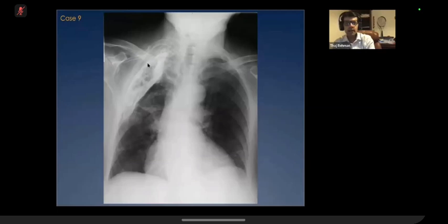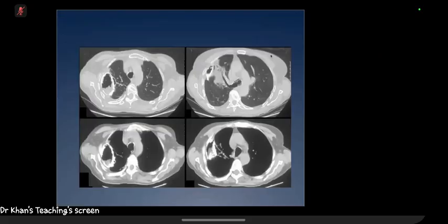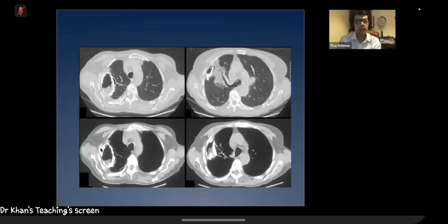It's a dense calcified structure. It usually happens from TB, from infection, an empyema. A long-standing empyema will develop calcium along the wall. So it is a sequela of infection, or a sequela of a traumatic big hemothorax, etc. So calcified fibrothorax. This is not pleural plaques. Please don't say pleural plaques. You have seen at least 2 pleural plaques today. That's a calcified fibrothorax.